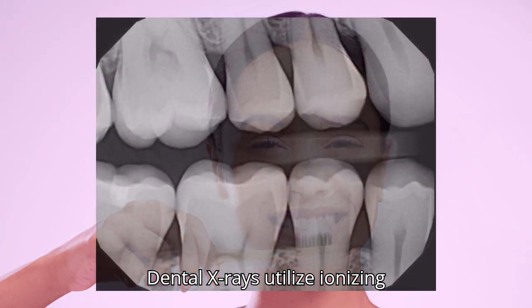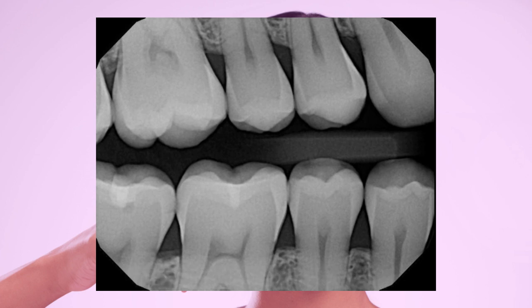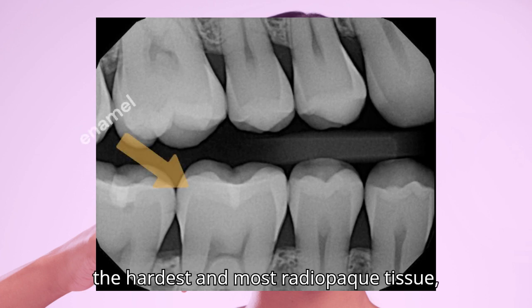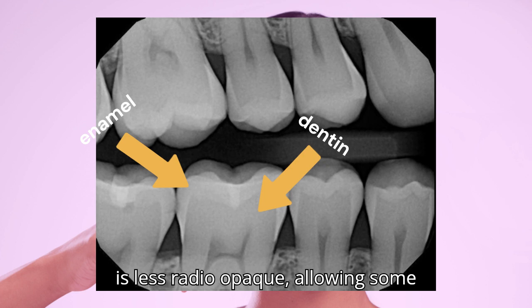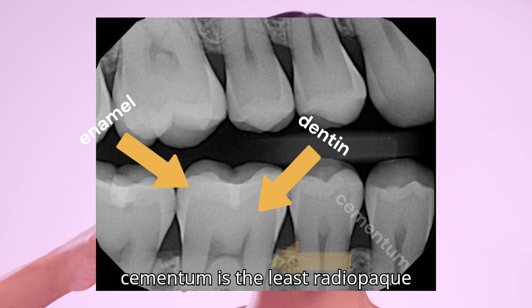Dental x-rays utilize ionizing radiation to visualize the internal structures of the teeth and jawbone. These x-rays are differentially absorbed by various dental tissues. Enamel, the hardest and most radiopaque tissue, absorbs a significant portion of the x-ray beam. Dentin, the underlying layer, is less radiopaque, allowing some x-rays to pass through. Finally, the root cementum is the least radiopaque structure.